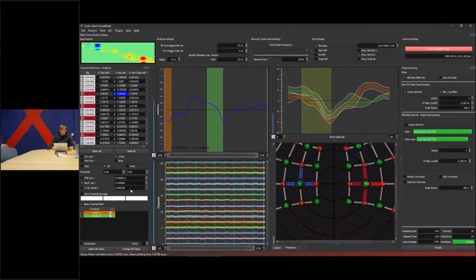So with this, at the end of the run, you have a full GLM based on the data, which allows you to make some decisions for the next ongoing runs.